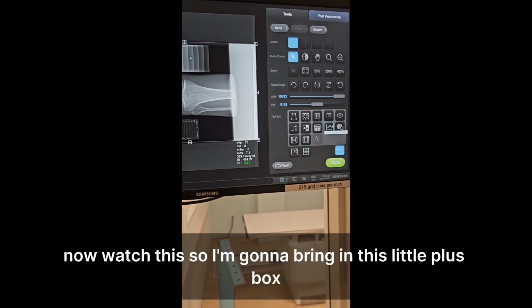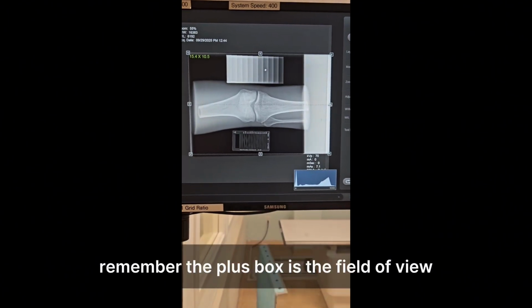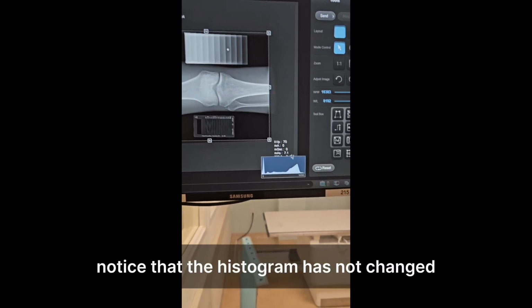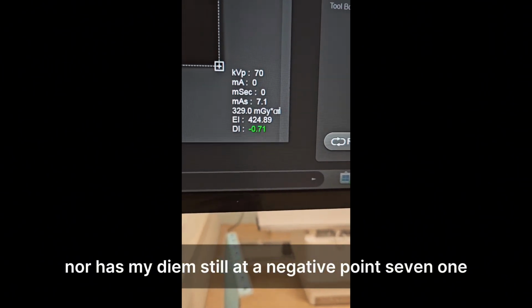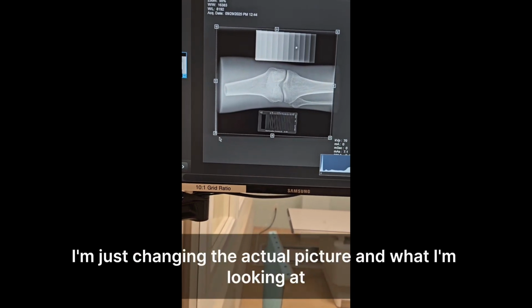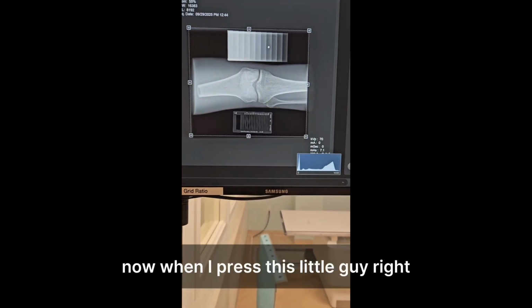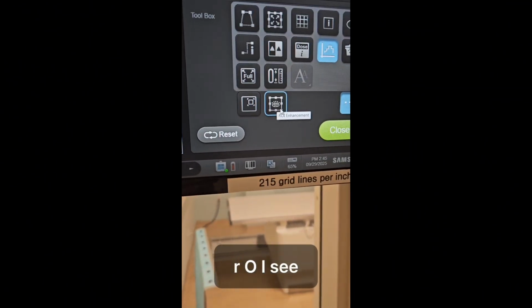Now watch this. So I'm going to bring in this little plus box. Remember, the plus box is the field of view. So I'm bringing that in so the field of view has changed. Notice that the histogram has not changed, nor has my DI. I'm still at a negative 0.71. Because all I'm doing is just changing the actual picture and what I'm looking at, but I haven't changed how it's processing.